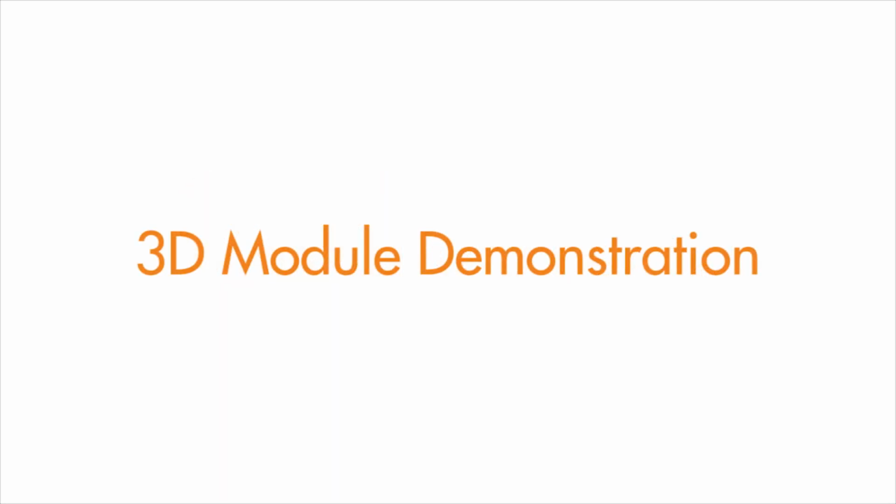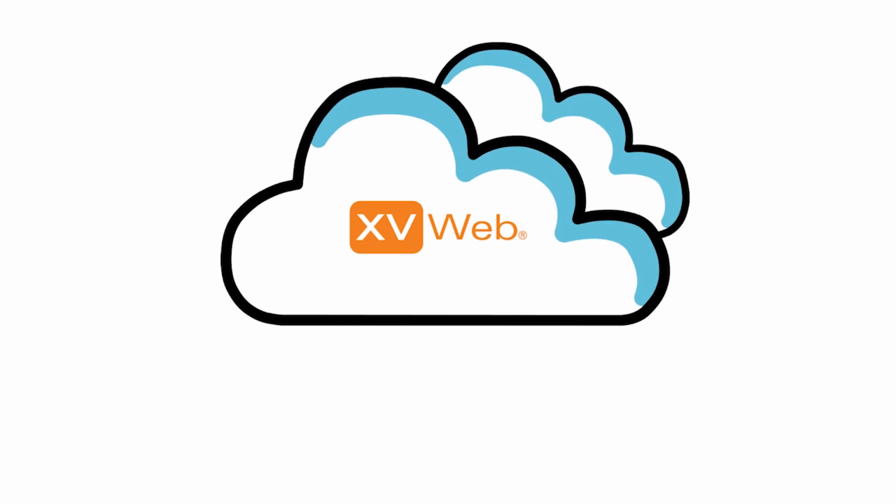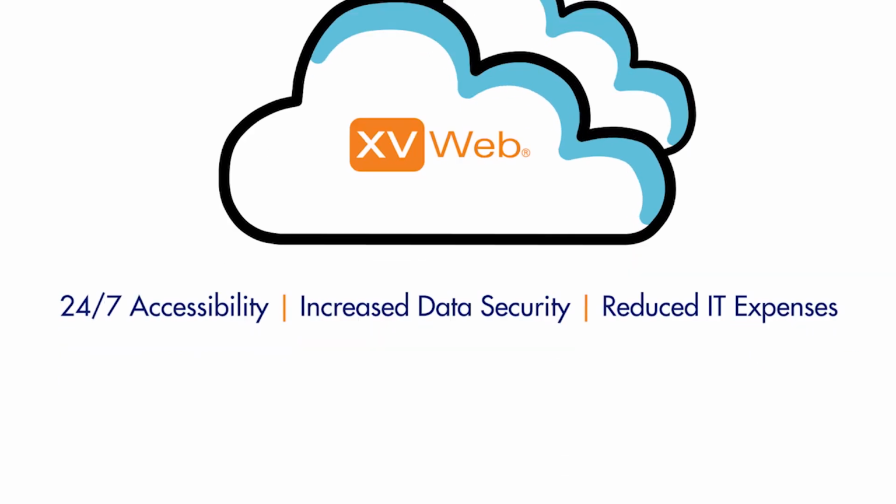Welcome to a brief demonstration of the 3D module for XVWeb. XVWeb provides cloud imaging technology to your practice, giving you increased accessibility, data security, and the ability to reduce IT expenses with reduced hardware requirements.